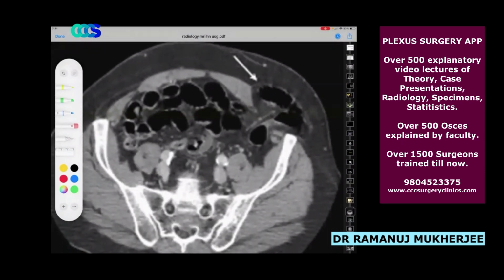If that was an umbilical hernia, this is another hernia. What is this one? This is a hernia that has occurred on the flank. Definitely this is a lateral abdominal hernia, probably a spigelian. The differential diagnosis, if I get more cuts, will be an inferior lumbar hernia. But one thing is very sure, you can see the gap between the iliac crest and the parietal muscles. If these are the three muscles, this is a much lower cut, and in this cut you can see the hernia. What is the content in this hernia? It is a bowel loop, and you can see this bowel loop very clearly.